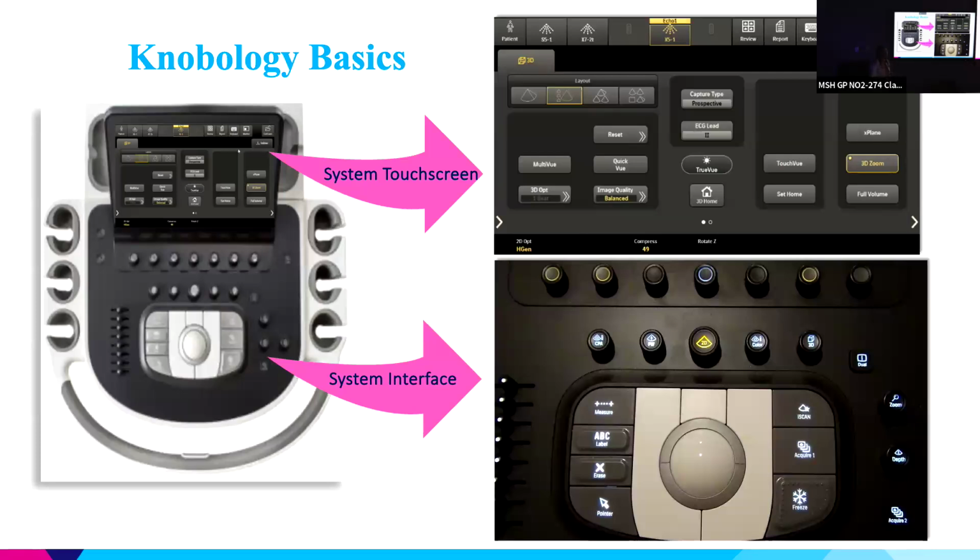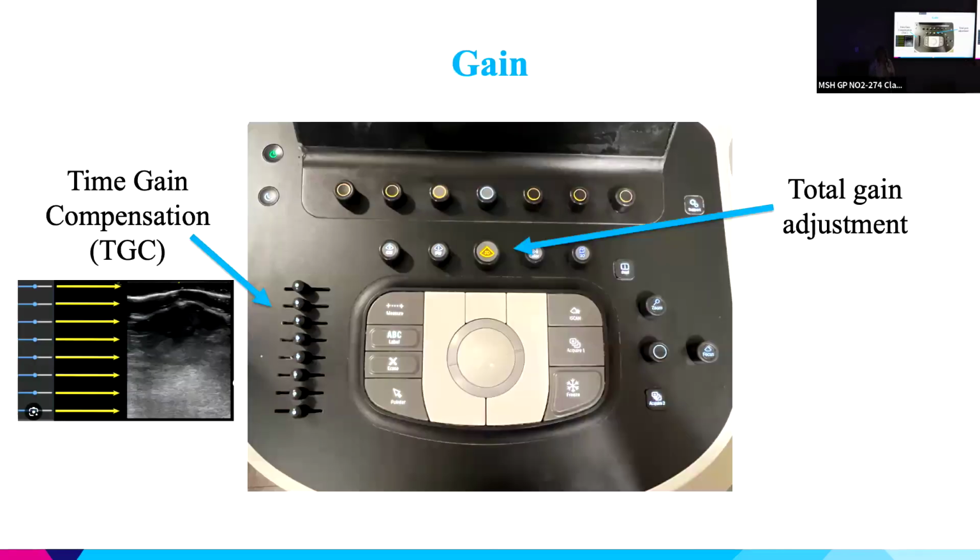Here at Sinai, we have Philips, so I'm going to do a Philips-focused talk today, and we're going to just jump right into it. The TGCs, you all know they're here, and this correlates with your screen. So this would be the top of the screen, and this would be the bottom of your imaging screen.